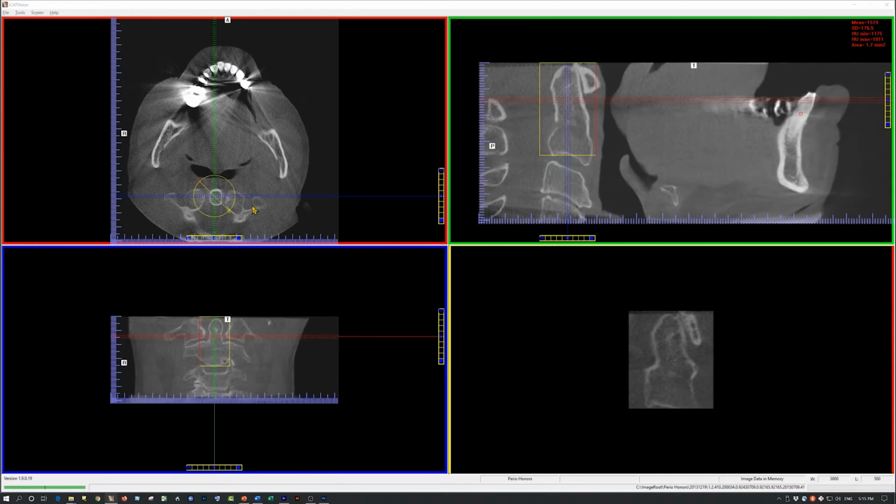So let's stop it here. Explore speed is self-explanatory. It's the speed of the rotation of the Explore ring. Let's go and select filter. Leave it at sharp and mild or normal.